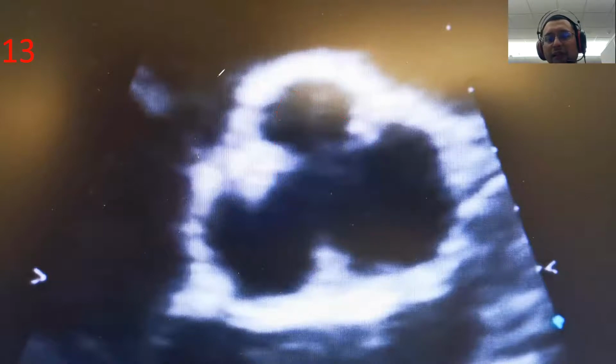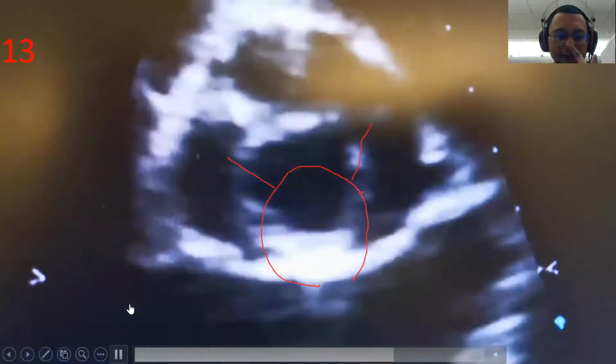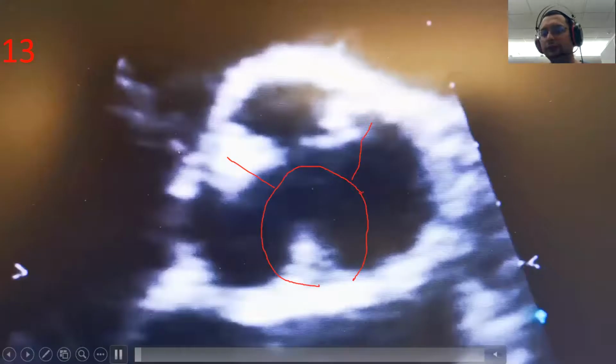In a patient with a tri-leaflet valve, it will open like this. Okay. This patient opens like this. Very weird. Open like that. And then after that, the patient got a raphe here. I even show it for you like this. Alien in the middle. The bicuspid one, where is the raphe?